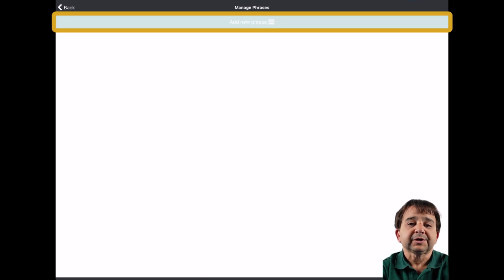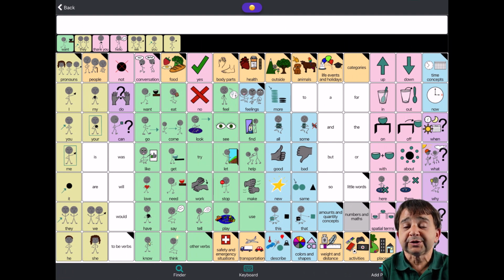And upon doing that, I'll be able to make any phrase I want. So usually when you're making a phrase, this would be something you say a lot every day. So whether that's in your everyday speech or something you may say a lot at work or at school. So I'm going to go ahead and I'm going to put in Welcome to Disability Network, Eastern Michigan.